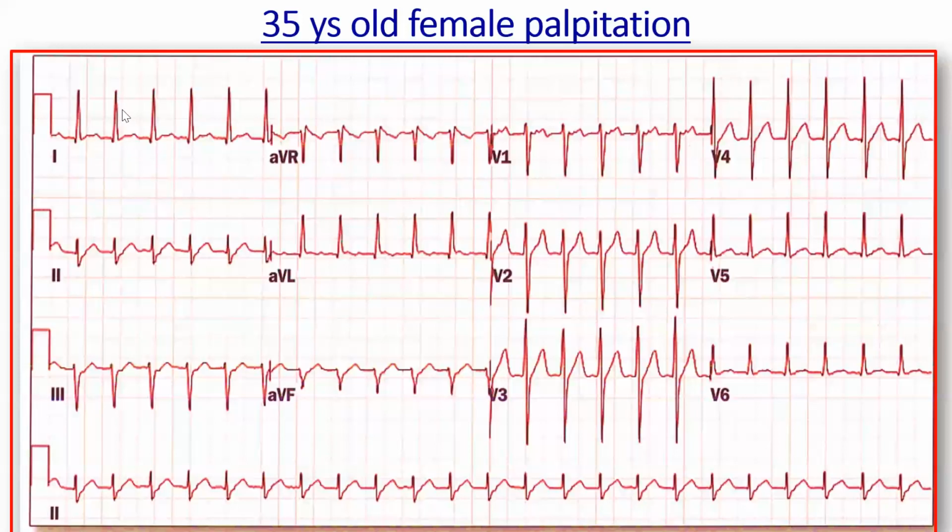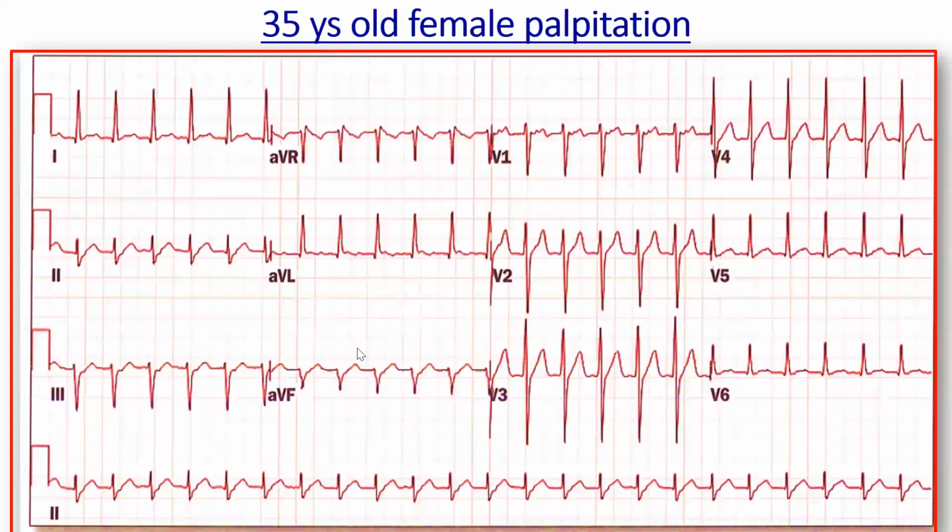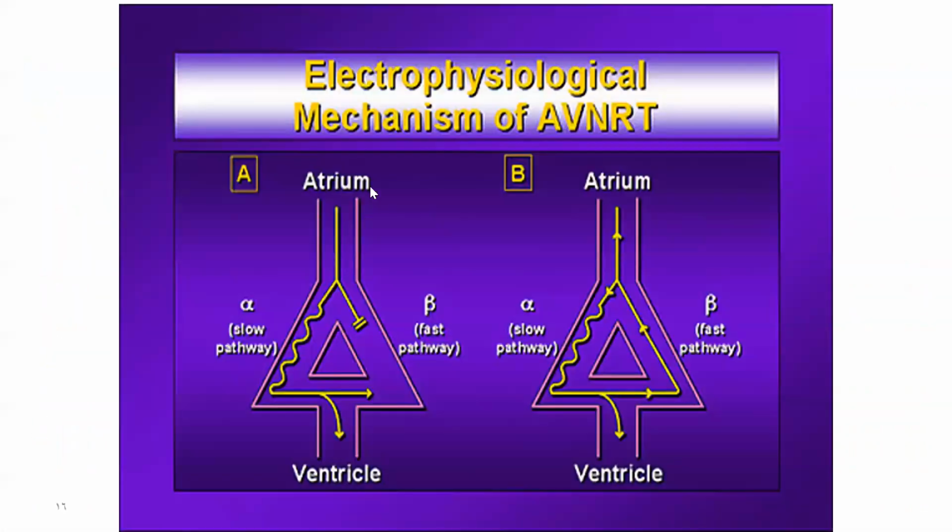This is for a tachycardia, which is a narrow-complex tachycardia. By approaching the narrow-complex tachycardia, we found there is no P wave before the QRS complex, and the P wave is retrograde, small in the ST segment, and RP is very short. So this is AV nodal reentry tachycardia. Other than this, there is the left axis deviation.